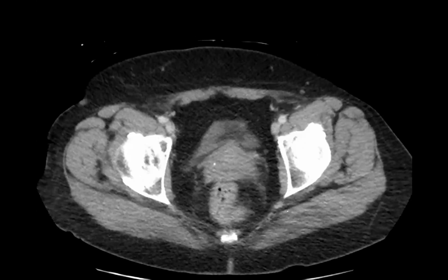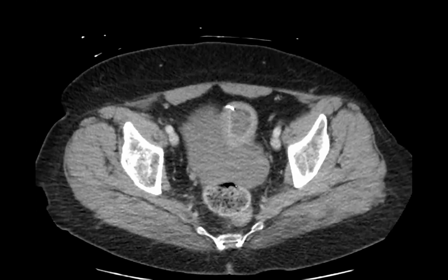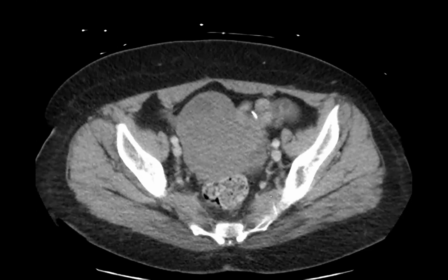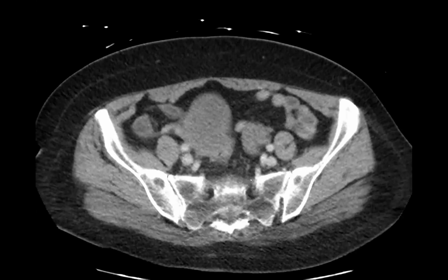Lymphoma? Okay. Because it looks kind of blobby and bland. How old is the patient? 60. With sudden left lower quadrant pain. Is it a localized hematoma? But it is very sharp. It can't be a hematoma. Still, yeah, lymphoma, we thought maybe.